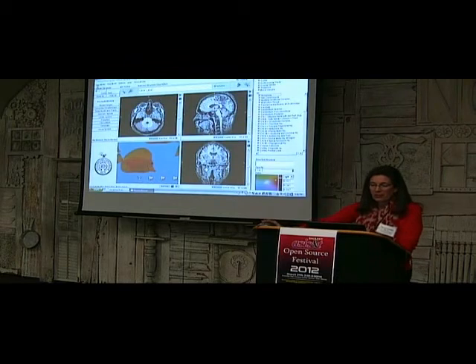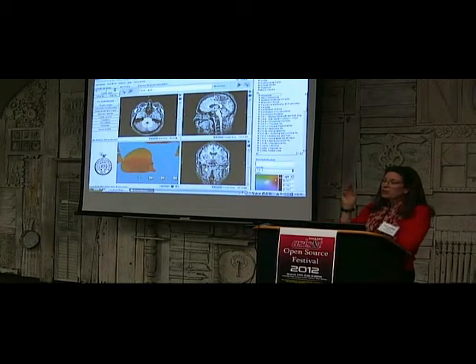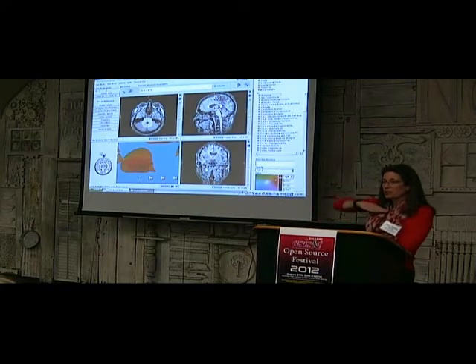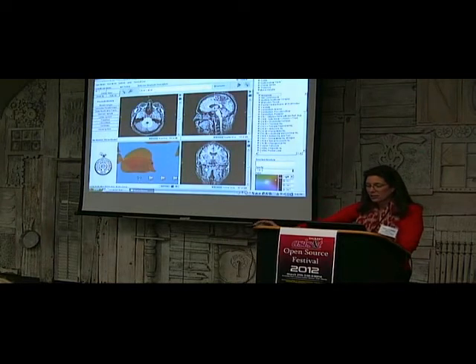So on the left, we have buttons that allow you to change the overall MRI color opacity, which means that you can look at an MRI in grayscale totally, or you can see all the colored structures visually. This slider up and down will allow you to scroll through the axial images from the chin, or from the neck all the way to the top of the head. This is a sagittal slice view, so it scrolls back and forth when you use the slider. And this allows you to scroll from front to back. This is the window that has the 3D models, which unbelievably will not work.